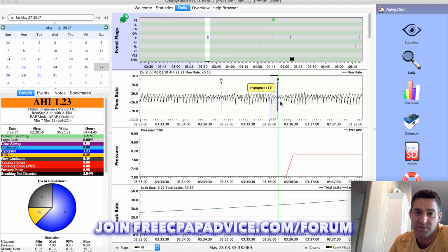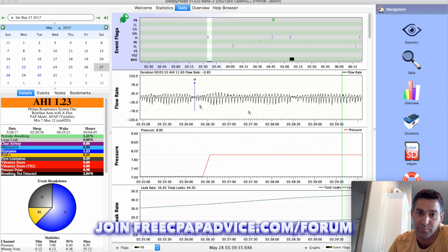Probably nothing. Here's some things marked hypopneas. I mean, you don't know if it's a hypopnea. To me, this doesn't even look like there's any arousal associated. It looks like there's some dips in breathing. This looks like REM breathing to me, so I'm probably just dreaming away and nothing. You'll typically see a larger increase in breath followed by some craziness, and then it'll settle down again if it's going to be a real event.